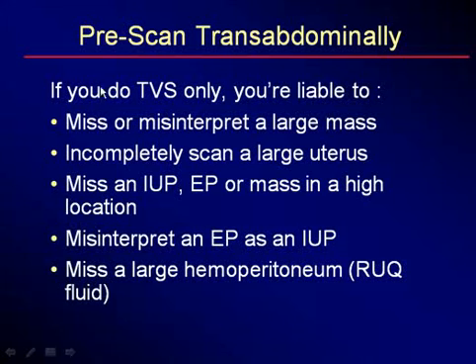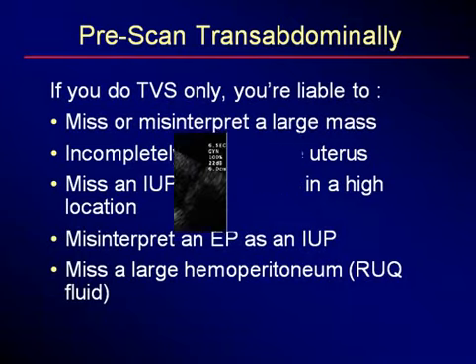If you do transvaginal sonography only and bypass this step, you are liable to miss or misinterpret a large mass, incompletely scan a large uterus, miss an intrauterine pregnancy or an ectopic pregnancy or a mass in a high location, misinterpret an ectopic as an intrauterine pregnancy. That's something that is unusual but could possibly be done. Or miss a large hemoperitoneum by not checking the right upper quadrant.